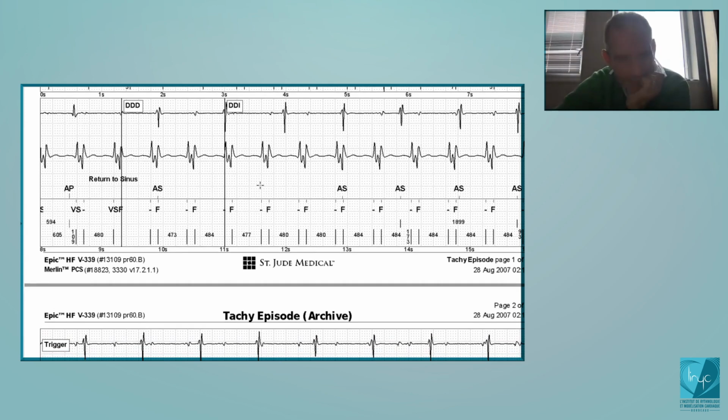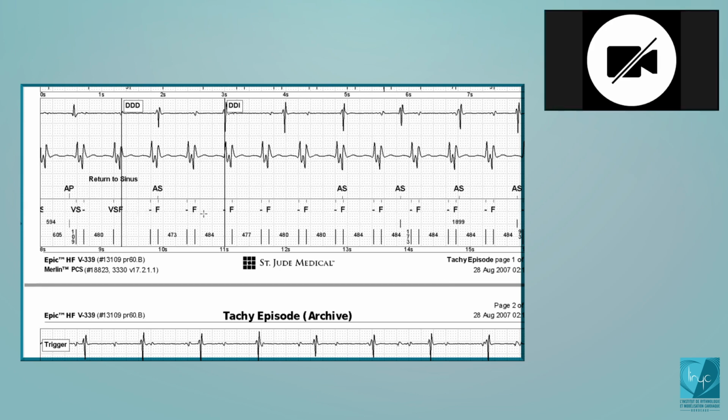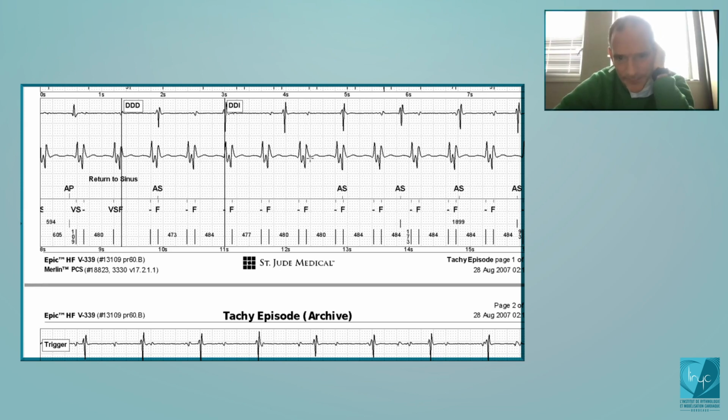So that's the thing you could program. But you see here, how will the counter for the VF work? It's going to be 1, 2, 3, 4, 5, 6, 7, 8, 9, 10. So there is clearly a very long cycle and a long, short, long, short, long, short. For all the other competitors, this episode will not be treated.